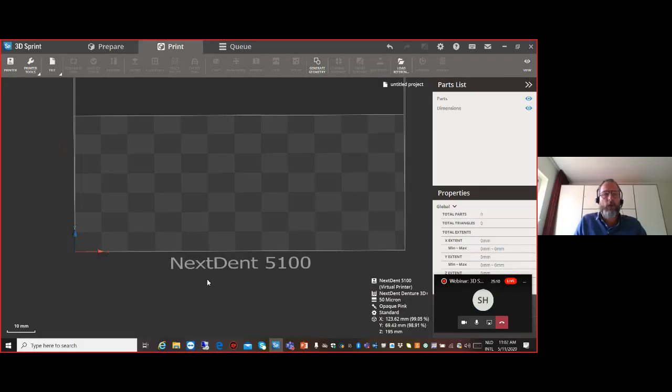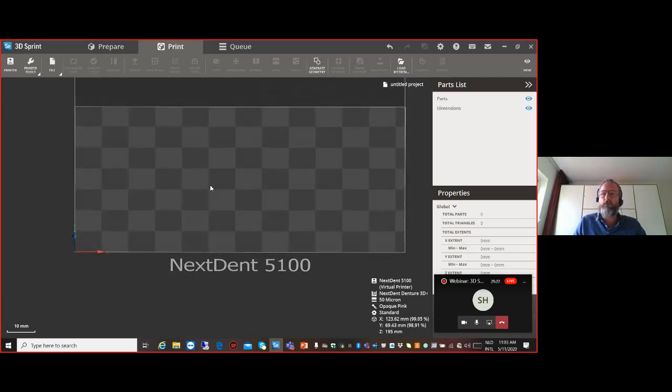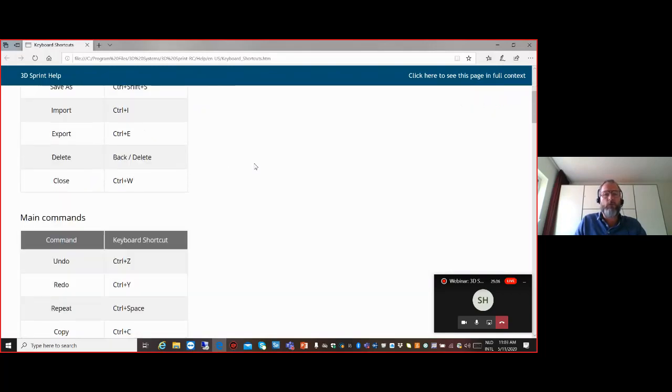Okay, Stijn, thank you very much for this introduction, and welcome everybody to indeed the launch of our latest software 2.13, where we have some very interesting features for all of you in dental. First of all, I would like to start with something that we call keyboard shortcuts. As you know, in a lot of software packages, you can make use of these shortcuts or hotkeys. And what we did for you now is that we just made it available for you here. So you can just click on it and then you will be prompted to an overview of all these hotkeys.